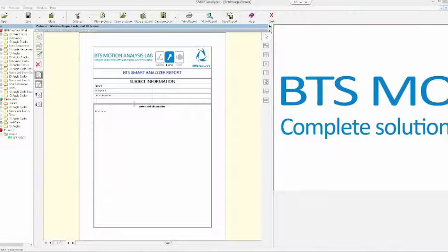When I save the report, only the title will be preserved, okay? Because we imagine that the second part will be changed every time by the user. This is the part that will contain the observation and the notes that we want to change every time. So let's now start creating a second page.